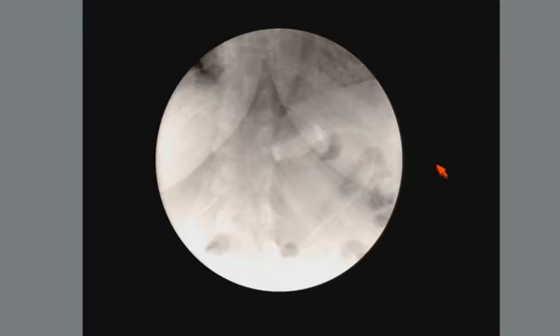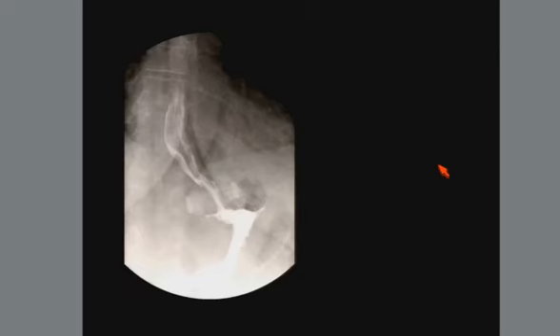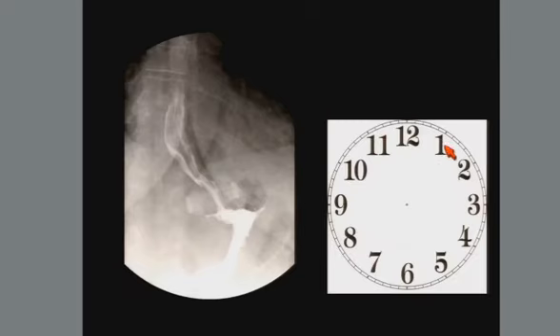So when we evaluate gastric bands, we look for the phi angle, as we see here. We draw a line through the spinous processes, a line through the thick portion of the band, and this angle should be roughly 4 to 58 degrees. And this is a normal appearance of the band. If the angle is different from that, it suggests a slipped band.